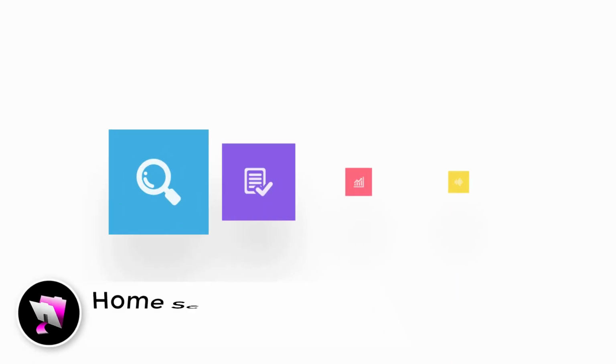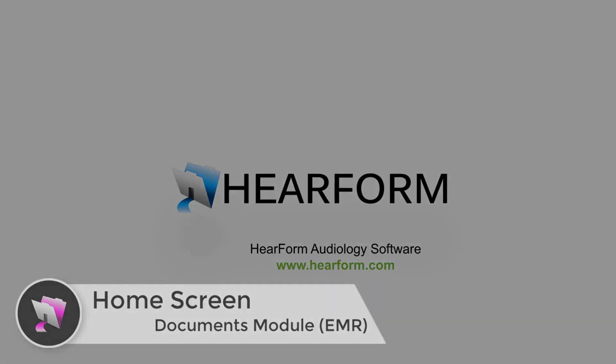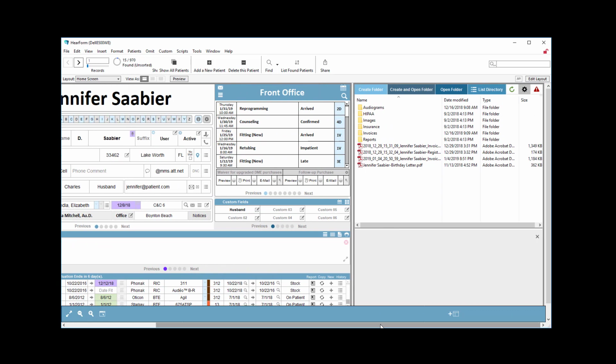Welcome back. This video will provide an overview of the Documents module, often called Electronic Medical Records. The Documents section in HearForm Pro can be used a number of different ways. Let me show you this area to the far right. You may not see this area unless we display the area for you.